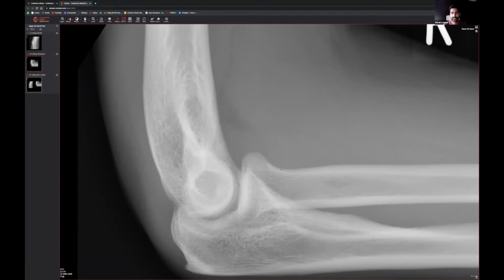It's a phrase that radiologists use, where you see an abnormality, you think, yeah, I've done it, I'm going to move on, and then you move on. But actually, a lot of the job for radiologists is just to look for the next finding, because the most commonly missed fracture is going to be the second fracture. Everyone gets all happy you've seen the first fracture, but it's the second fracture that gets missed. And that's the thing that you need to be looking for with these things.